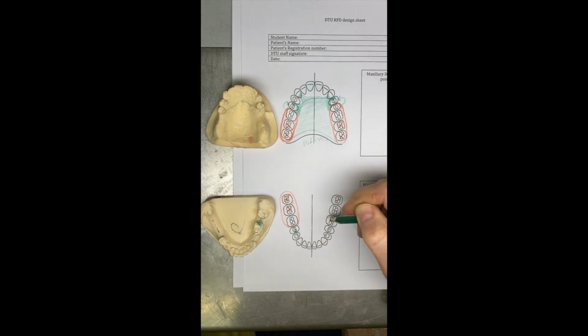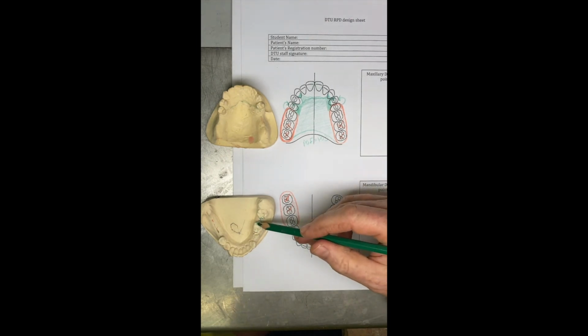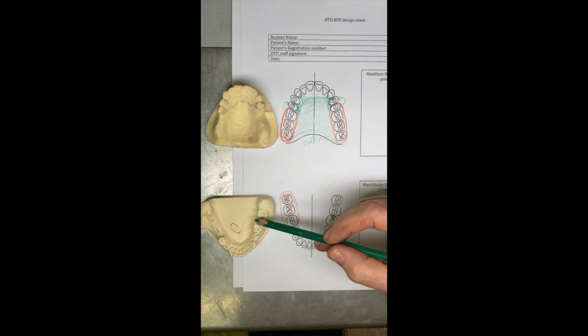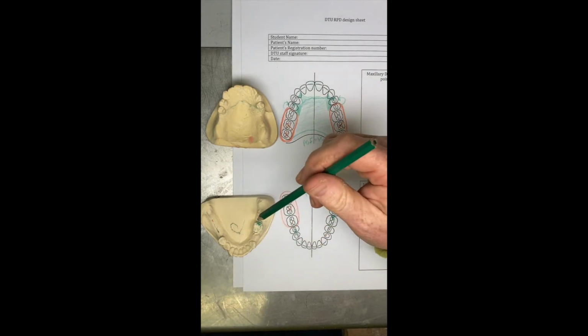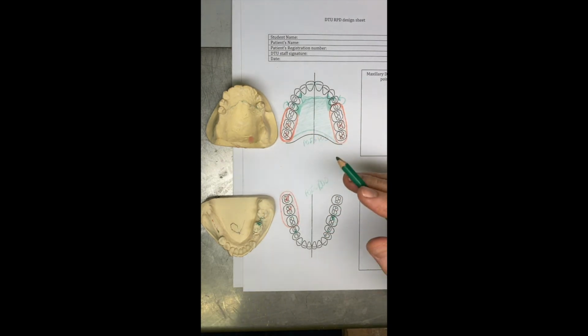We're going to need some support around this side of the arch, so that's where I'd go for the 6 because it's easy to access here, and I'll put a distal occlusal rest on here as a minimum. And once we've done our support, we can think about retention. So back on the surveyor, surveying this tooth and this tooth particularly, considering whether we want to create a path of insertion. In this case, I'd keep it simple again and just make the path of insertion equal the path of displacement. Because again, there's a little undercut and it'd complicate things trying to engage with this tooth as well at the same time. So I'd keep it simple.